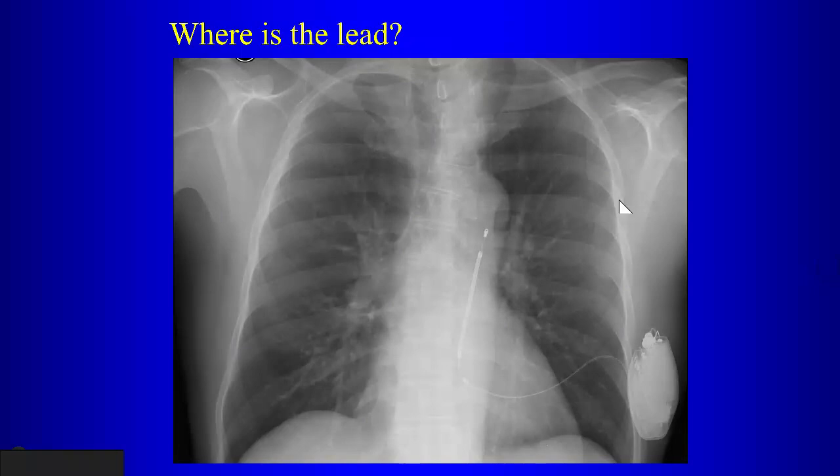Is that going up to the aorta? So how would that get in the aorta? Maybe through the left ventricle? So somebody put a hole in the left ventricle and then snuck this lead up into the aorta. First of all, if it's going up into the ascending aorta, what's the course it would take?